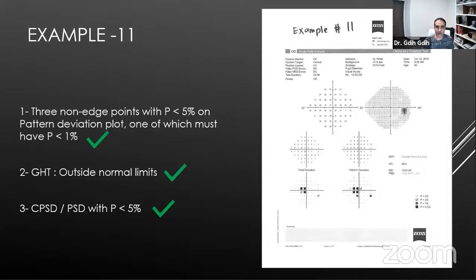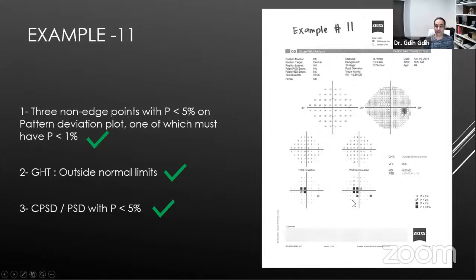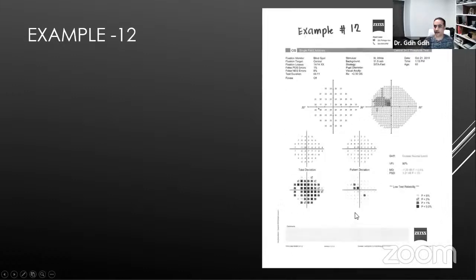You know these acquired pits right in the middle of the optic nerve. It can give you something similar to this. It is still possible glaucoma. But again, we should go back to the tree that we follow. If we see something correlating to this in the optic nerve, and we go through this, then yes, the criteria would be right.